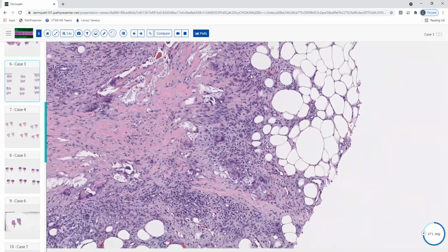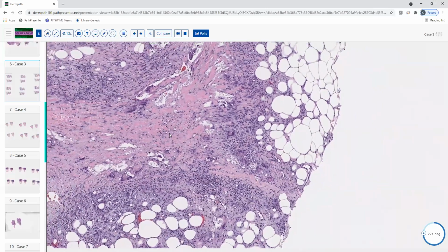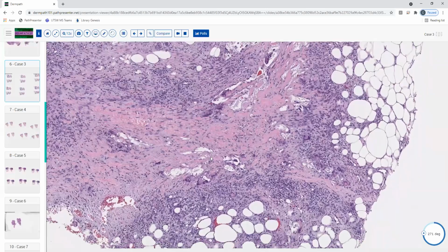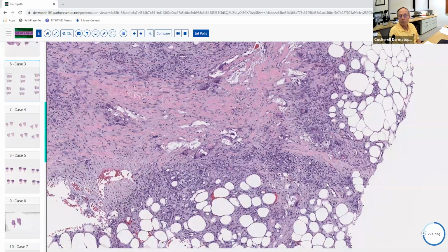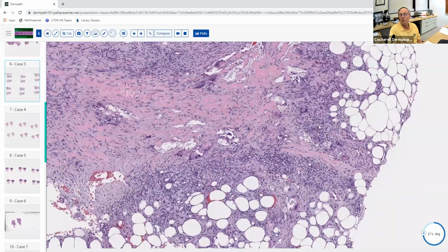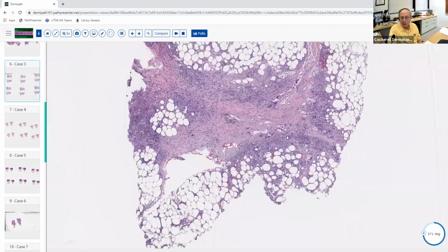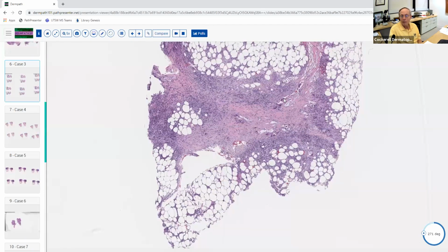But I don't think anything necessarily predominates. Maybe some lymphocytes as well, because there's some cells that look black. But you're correct. It's a mixed infiltrate, and it's actually got definitely the multinucleated giant cells here. It's got a granulomatous component to it. So basically it's a granulomatous, mostly septal panniculitis. And notice where this granulomatous inflammation is located. It's located right at the periphery of the septa and the lobule.